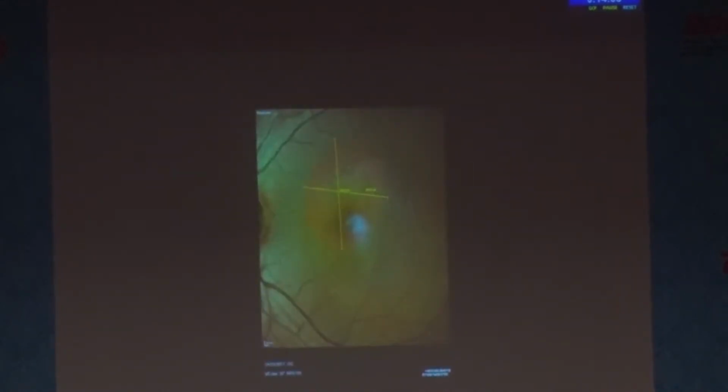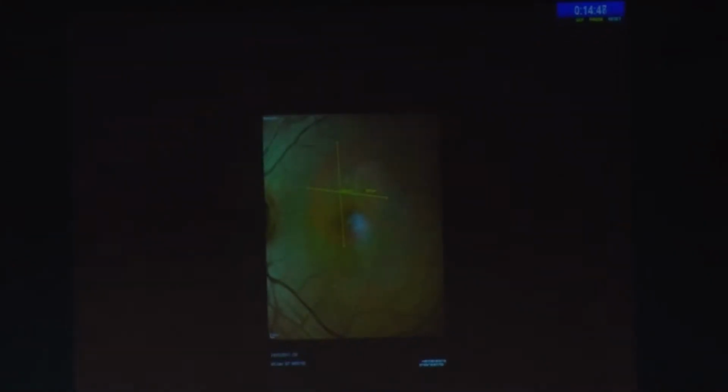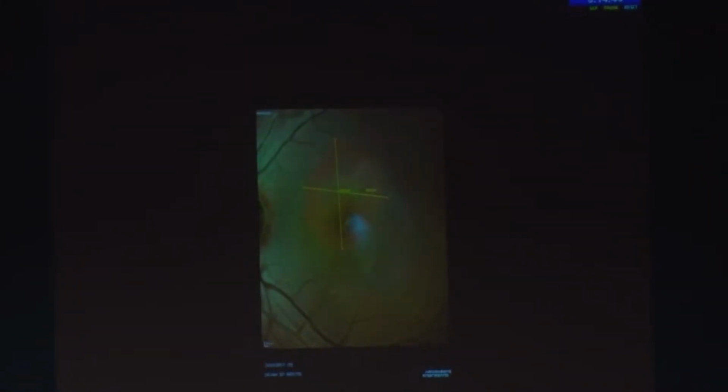So I think slightly touched upon this, the case was... So can we have, first we'll start with Dr. Anand, multimodal, multicolor imaging. So I think based on what Manoj said, this probably could be a nevus kind of thing. This reddish, there's no edema over that. There's no greenish stuff. Okay. So looks like a well-defined lesion, possibly.